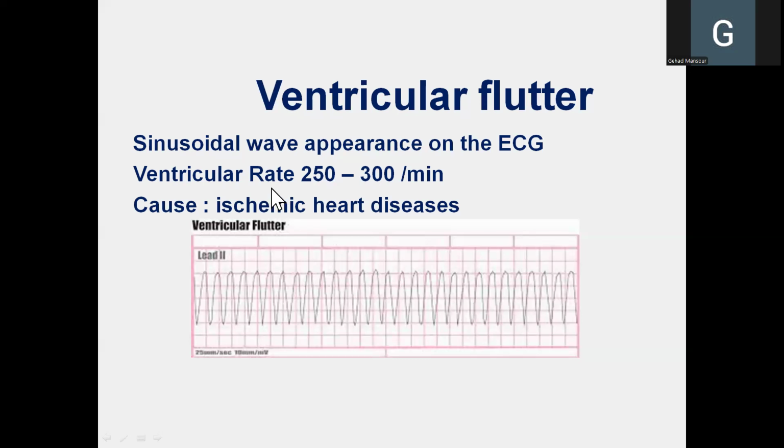So ectopic is something that is not at the normal position. So here, wherever the ventricular ectopic focus is, we will have this very characteristic shape of the QRS complexes that we say is sinusoidal. It's similar to the sinusoidal curves that you study in calculus, for example.